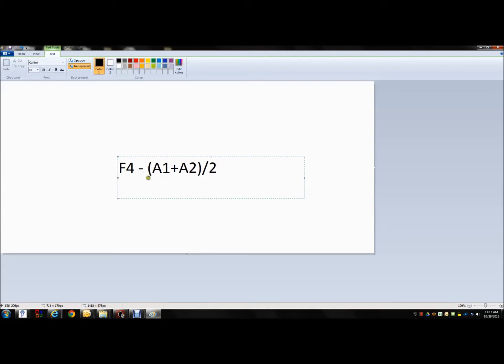Your digital machines should have this option to have a linked ear reference. What happens is it takes the A1 plus the A2, which have the contaminated EKG signal, and it cancels it out, because it averages these two together, effectively removing the EKG artifact.